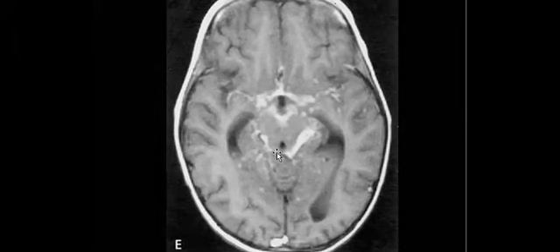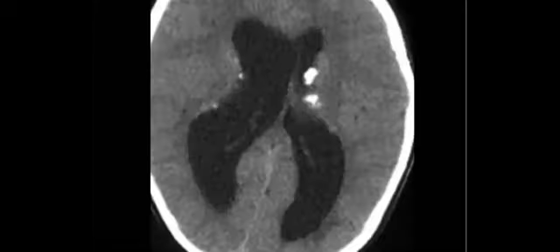almost basal, right? So basal meningitis can be infection like TB. What else? Metastasis, do you agree? It can be leptomeningeal metastasis, or yes, it can be sarcoid, but that happens much more in older age. So for this pediatric patient, basal suggests TB. This is what's called basilar meningitis, at least.